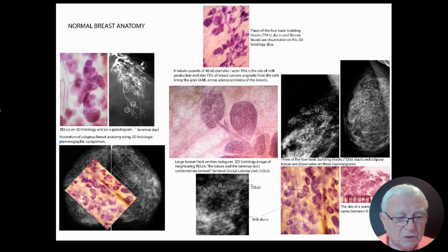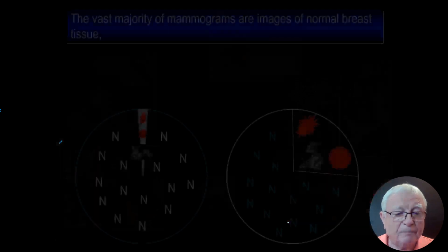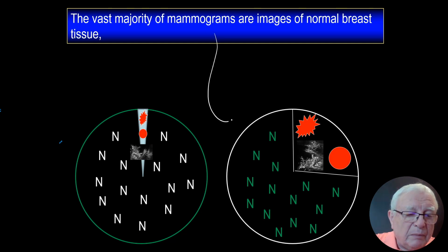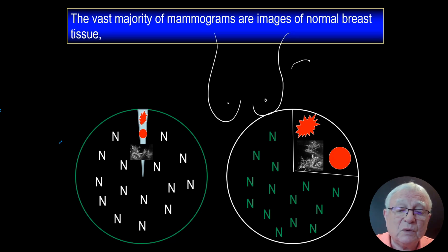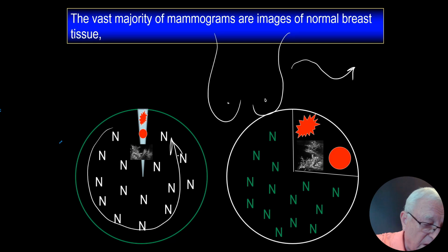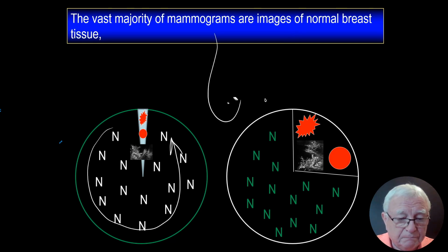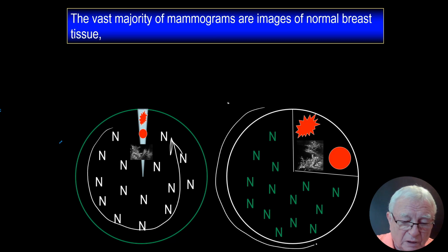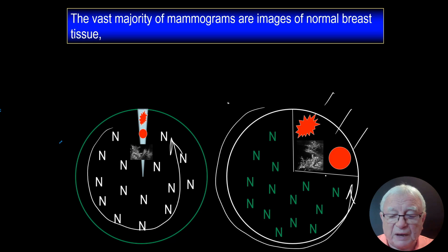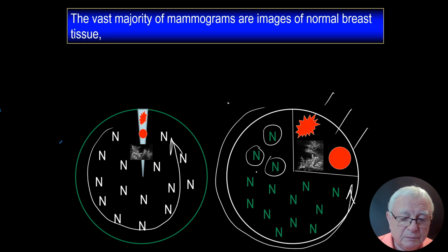Well, of course, this is a harmonious image, entirely normal. Well, this is our biggest problem. Unlike any other organ in the body, the mammograms, the breasts, are varying from woman to woman and with a 10 or 15 years difference, even in the same woman. Whether you look at the screening mammogram, that is asymptomatic women, or you look at the mammograms of your 1,000 referred cases, palpable lump, breast pain, and so on, most of them are normal.